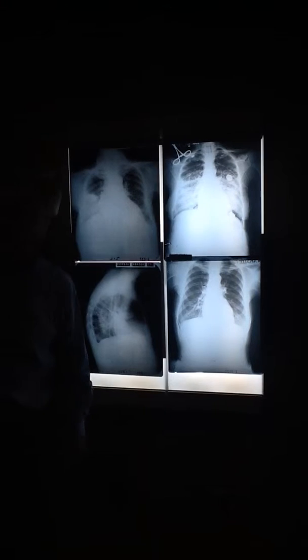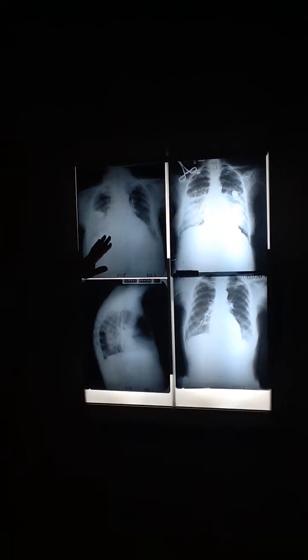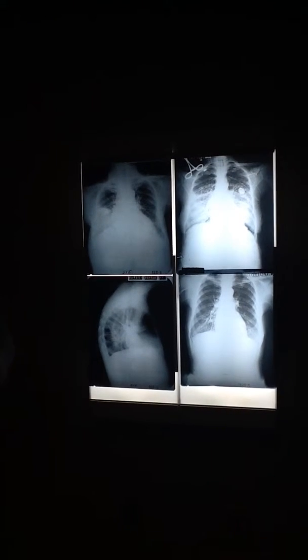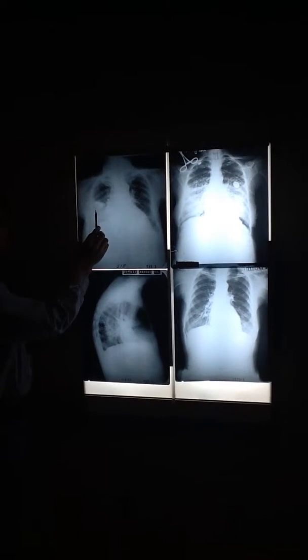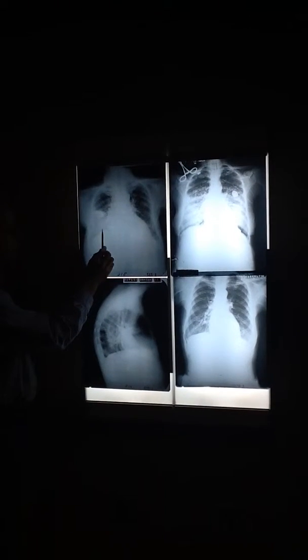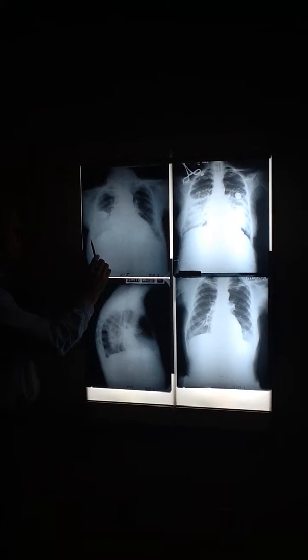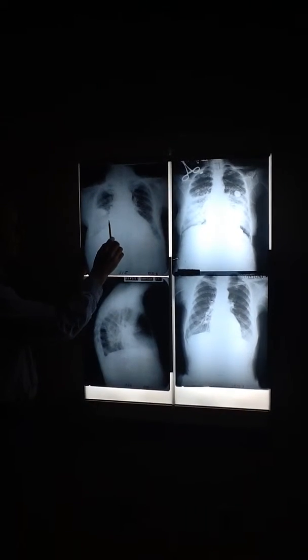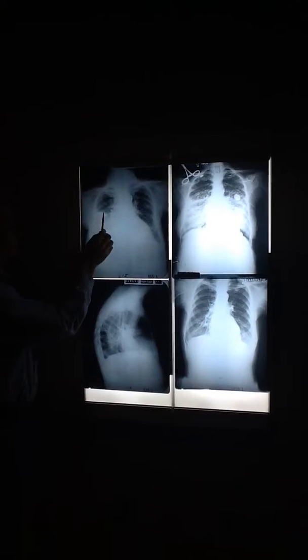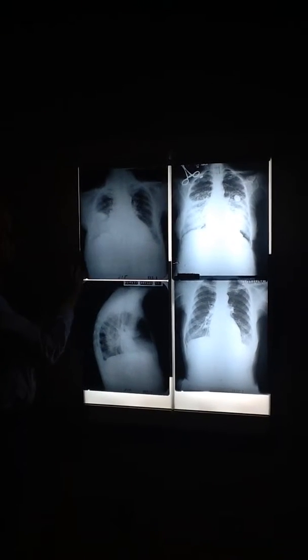This one's very similar to that first one over there. Very similar, except this one has a pleural effusion. You see this density right here? And then there's a hazy area below that, down toward the diaphragm. No silhouetting on the diaphragm. We may be getting a little silhouetting in here, a little hard to tell. This one, though, is very bright, isn't it? This is less dense down here.